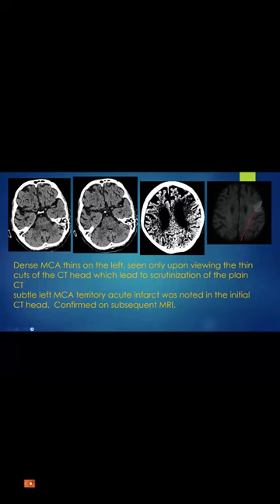So this is CT showing this hypodensity, DWI showing diffusion restriction, and if you run the thins, you'll be able to see the dense artery sign that the resident actually didn't see because they didn't look at the thins. They just looked quickly at the thick slabs or thick cuts and were not able to see this. So basically, the resident didn't do proper windowing and didn't do the thins, so he missed that infarction. Okay, so it's very important to know where the misses are.